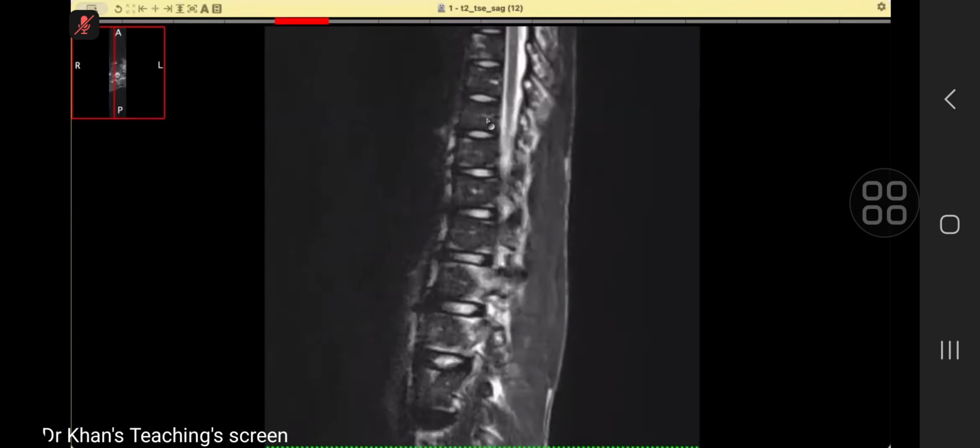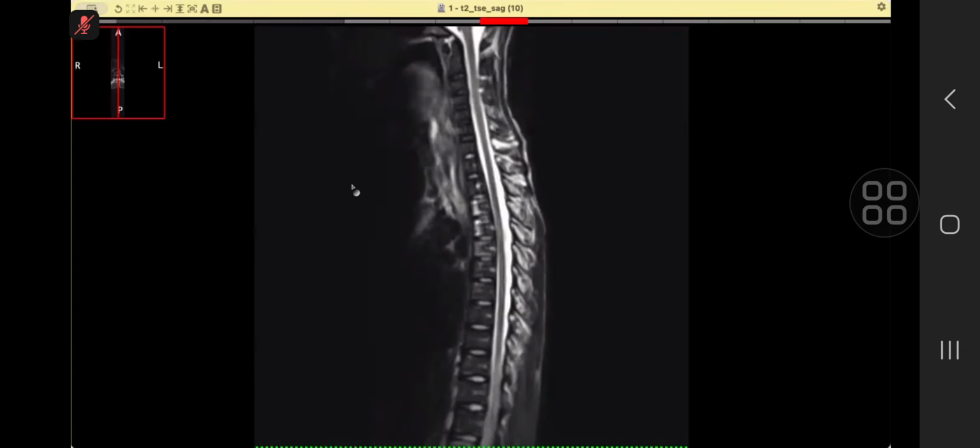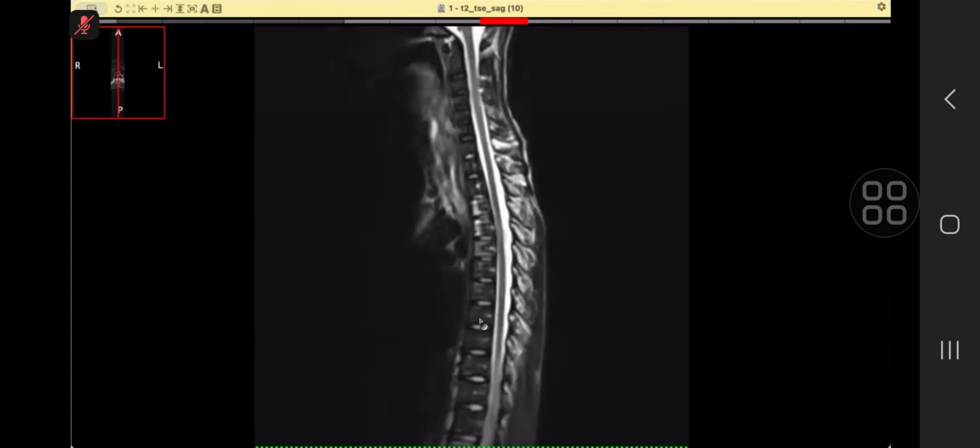I did not show you, but we did an MR of the whole spine, and there were acute infarctions. If you see here, this is a STIR sequence, and look at the bone marrow. That is why the patient was in great pain. So this is, you know, the H-shaped vertebra. This is the double. Look at these acute infarctions. Whole of the spine was involved. So these are manifestations of this, so you can get a long case out of this also.